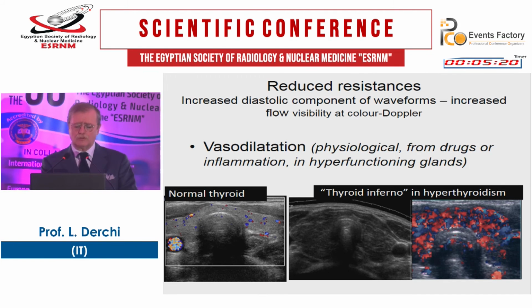This can be seen also in patients with physiological vasodilatation or from drugs or inflammation on hyperfunctioning glands. This is a normal thyroid, and this is the thyroid inferno in hyperthyroidism from Graves' disease.